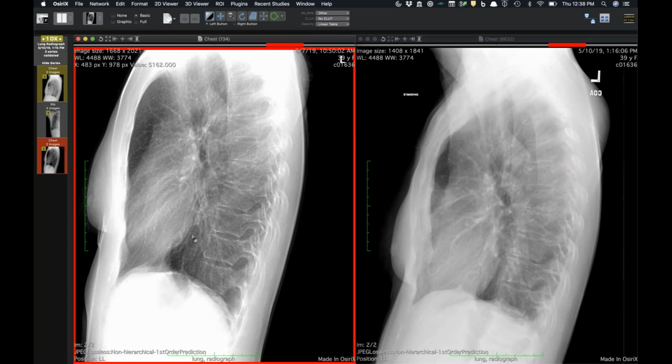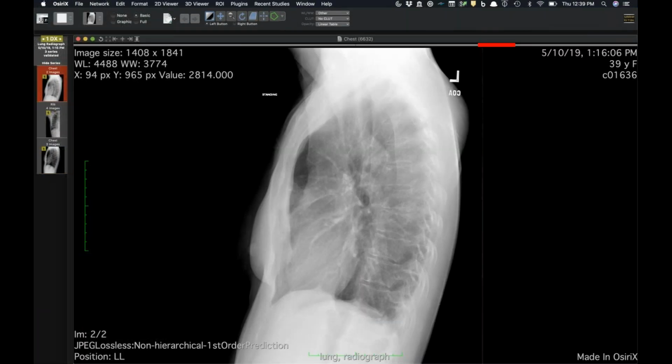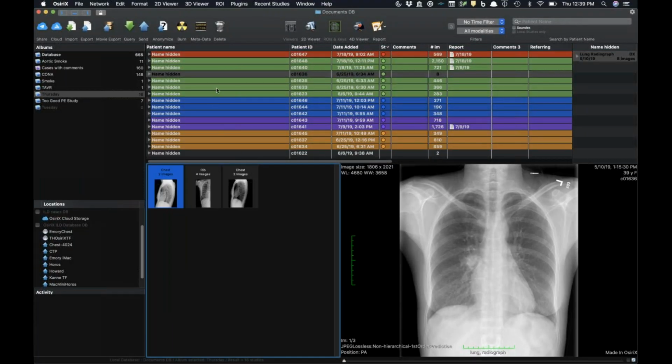So yeah, again, rib series don't really have much utility since diagnosing minor rib fractures on them doesn't really improve patients' outcome versus just supportive care, even if you miss a rib fracture. But in this case, it was a nice, nice oblique view to see this little focus of presumed pneumonia.